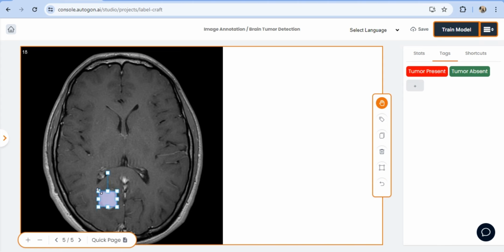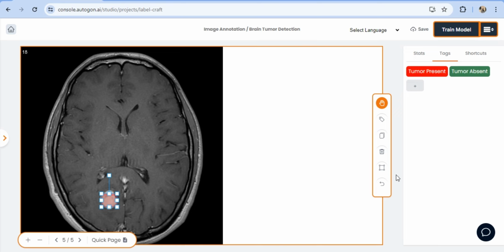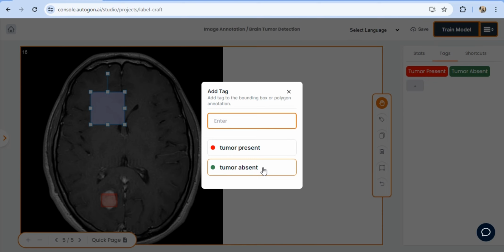You're good. So remember, as I said, you want to make sure that at every point in time you are annotating properly and you're saving properly and you're giving your model enough information on how these things can look.